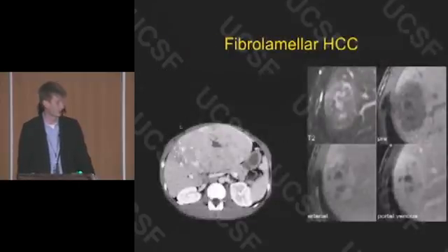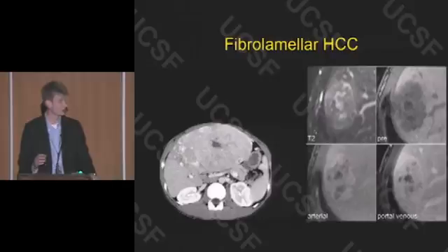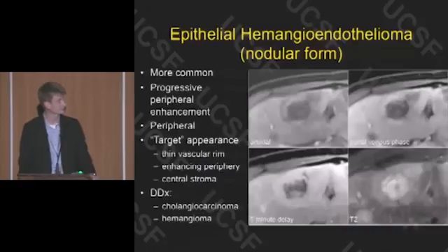Here's another case of fibrolamellar HCC, central scar in another case with fibrolamellar HCC. It's sometimes difficult to come down to a specific diagnosis, but in the right patient population, 20s, male, with a large focal mass, you should be thinking of a fibrolamellar HCC.